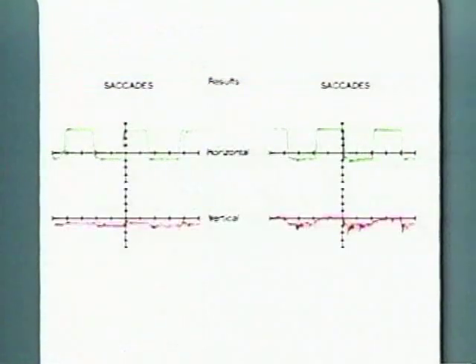The following examples are a combination of both normal and abnormal forms of data. The first two tracings show normal saccadic movement, demonstrating a good square wave type configuration.